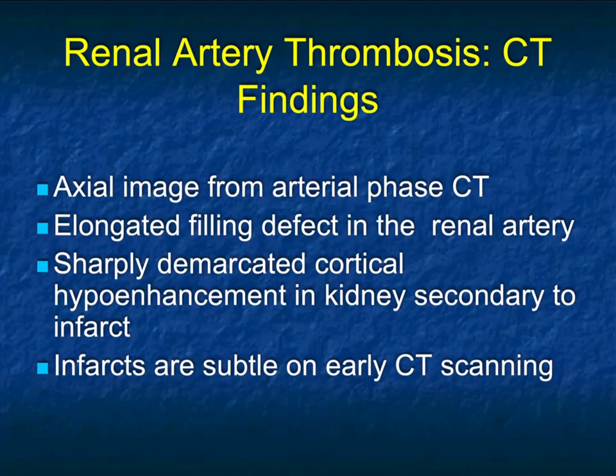We talk about looking at the renal artery again, looking at perfusion, looking at both the renal artery itself, but also the perfusion of the kidney. Sometimes the thing you recognize first is the perfusion changes, particularly their wedge shape, and then you look carefully at the renal artery, looking for aneurysms, dissections, narrowing, beading, and the like. Infarcts can be subtle, particularly early on. Also, it's easy to miss infarcts, as well as many things, if you don't do IV contrast.